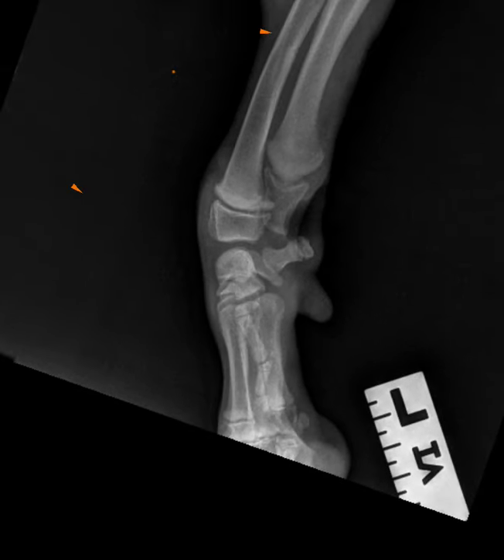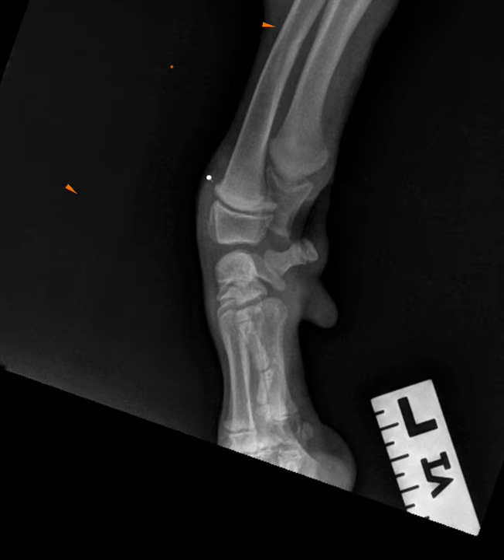So for me, what I would say on this case, when I go through my B for bones and I get into that subroutine of size, shape, opacity, margination of the physis, I'd probably make the following note. I think what we would say is that there's maybe a little bit of flaring here at the metaphysis. That's the term we use when we see a bit of osseous bone sticking out on the metaphyseal side. This is quite frequent, and so interpreting flaring can be quite subtle.